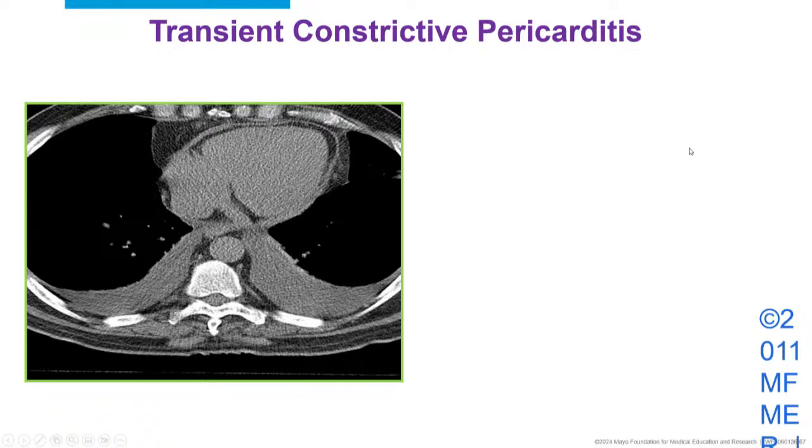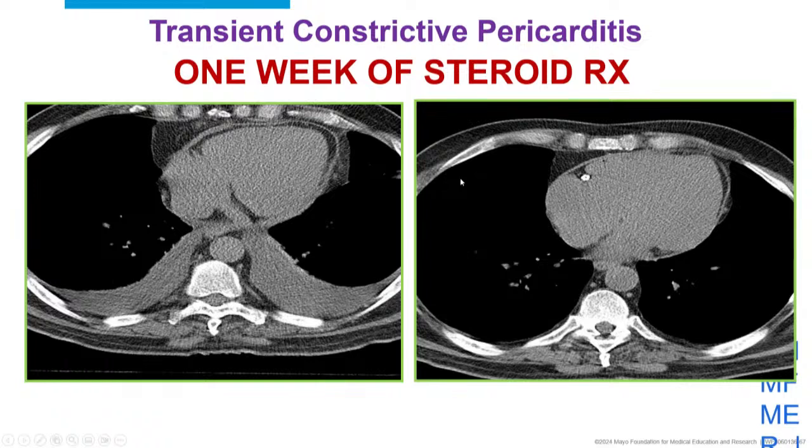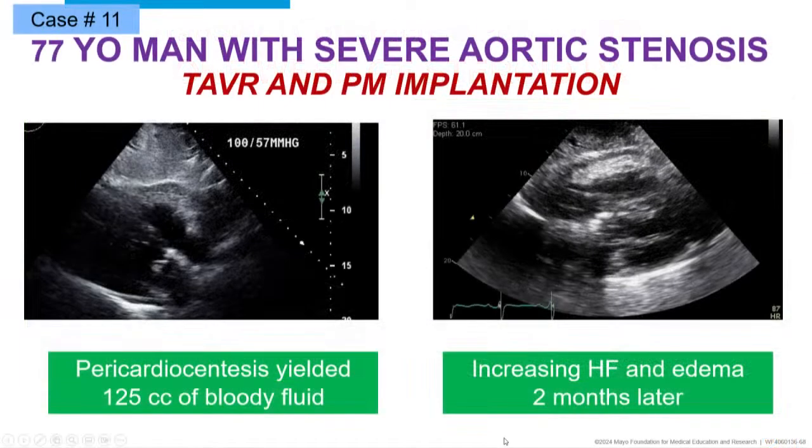And this is the one that is most impressive to me: the patient has 8 millimeter pericardial thickness and a lot of inflammation on cardiac MRI, and was given steroid for 1 week. And you see so much dynamic change, from 8 millimeter to 2 millimeter, with no pleural effusion, right? So this can change so quickly, and medical therapy can really work on it.